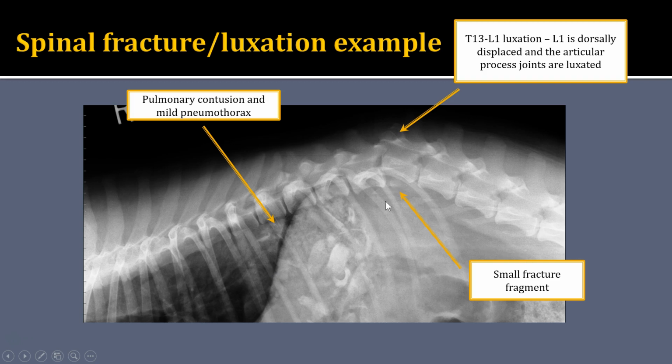We would also want to evaluate the retroperitoneal space as much as possible and the peritoneal space. Remember when we talked about technique, in these patients, especially if you're really concerned about fracture and luxation, we won't routinely right away obtain that orthogonal view. And so the examples here I have shown you only had the lateral views.